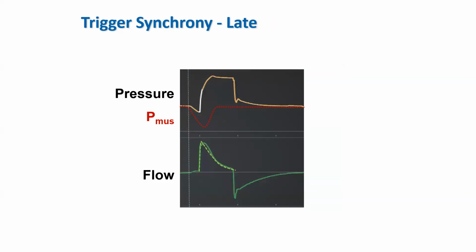This, however, is what we call the late trigger. So the patient's effort starts here, and the ventilator doesn't trigger until way over here.